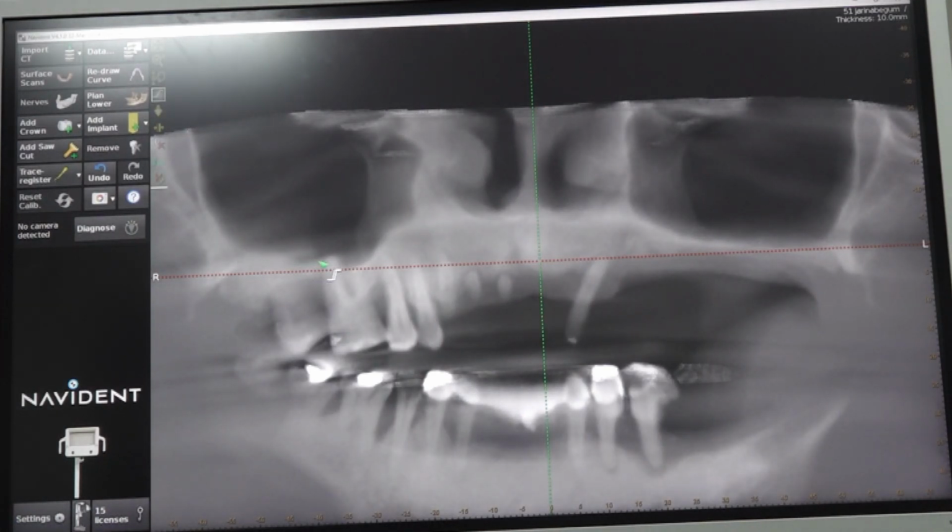The sinus. In the 6 area it is way down, even in the 5 area it is closer. Maybe the 4 area, various things, right? In the 4 area above the external root bone is there. This is the nasomaxillary buttress area. So we are getting good bone over here. But here, if you see, the sinus is invading through the nasomaxillary buttress area, right?